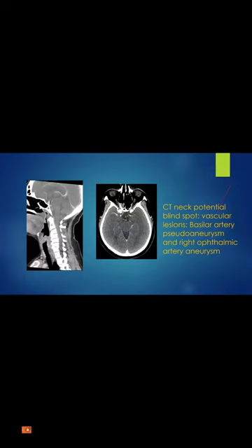This was actually again a neck CT scan, followed up many times, but the missed thing was this basilar artery pseudoaneurysm. In 3-4 CT necks, it was not seen. So just to remind you where to look and what to look for in these specific situations.